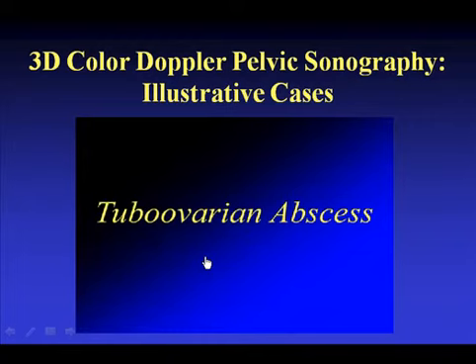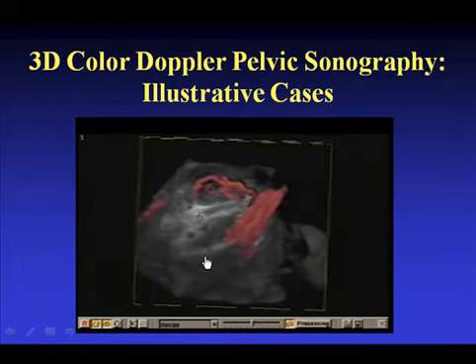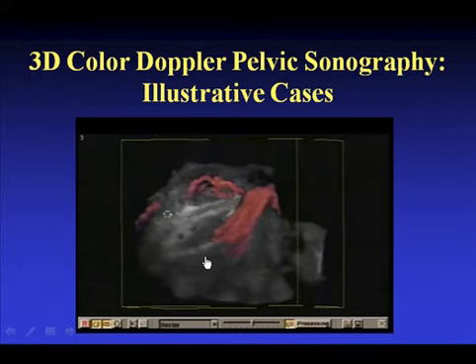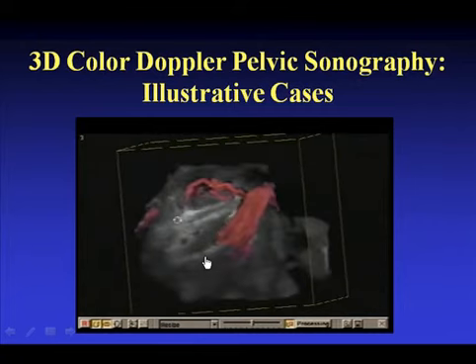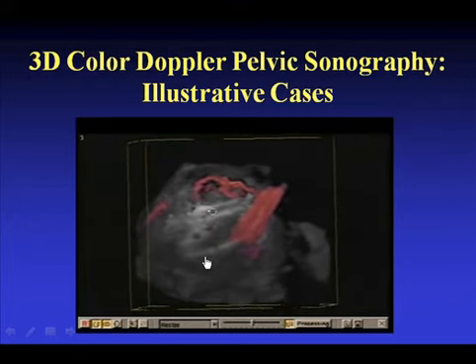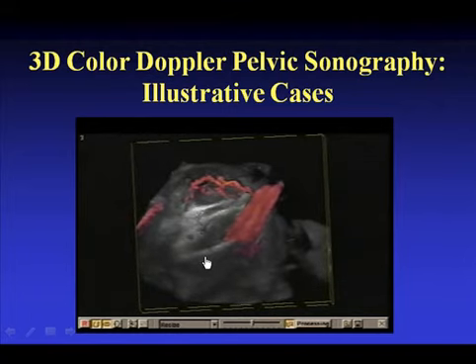This is the lesion that I showed on the earlier portion of the talk. This is a large tubo-ovarian abscess, and here are the abnormal vessels, and we can see the 3D volume here. I was asked to aspirate this lesion, but I wanted to show them the vessels that may be traversed, and this 3D was very helpful to convince them not to pursue aspiration of these lesions.